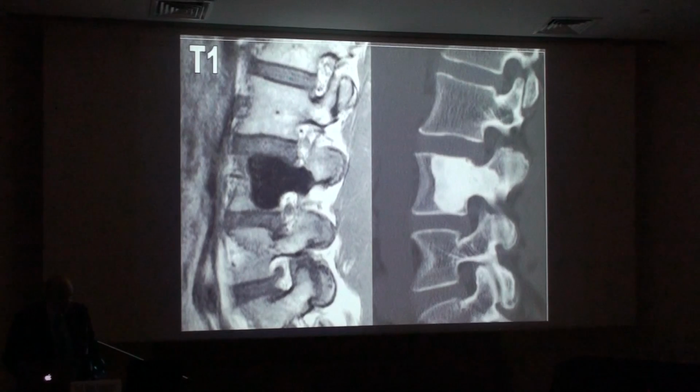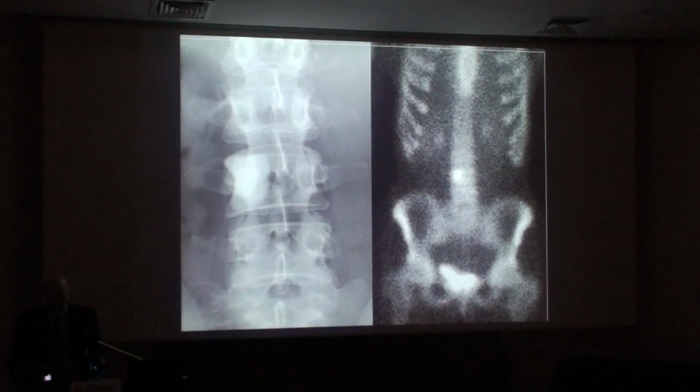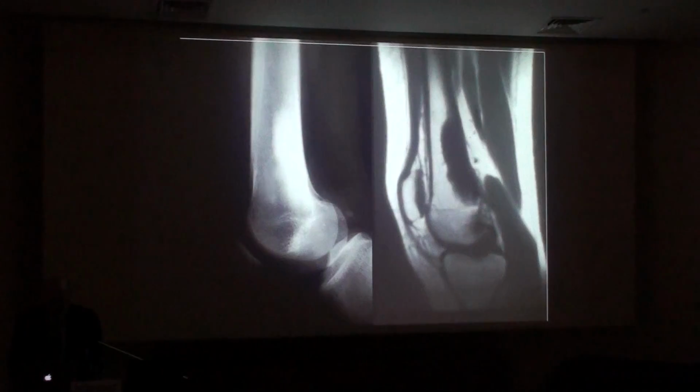And sometimes when they get quite large and seen like this, there can be some changes in the signal intensity and attenuation, although they're usually quite minor. Because of the large size and because it does take up tracer as cortical bone would, when they're very, very large, we can see some increased tracer accumulation as seen in this biopsy-proven bone island of the spine.